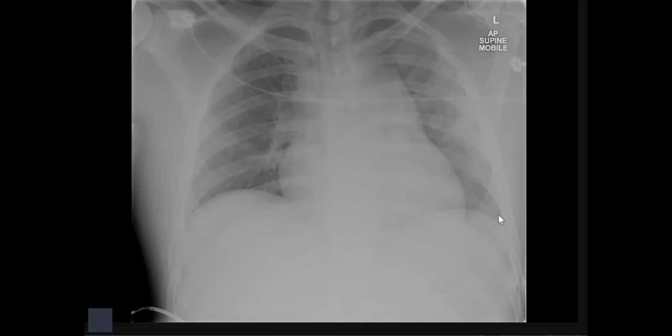I don't see any abnormal bone injury in the sternum or vertebrae. No rib fractures, and an intact hemidiaphragm. Why I mentioned the intact hemidiaphragm: because in trauma, diaphragmatic rupture is a serious complication in case of high speed motor vehicle trauma. So I will inform this finding urgently to the referring physician and arrange for an urgent CT angiogram or contrast CT for this case.